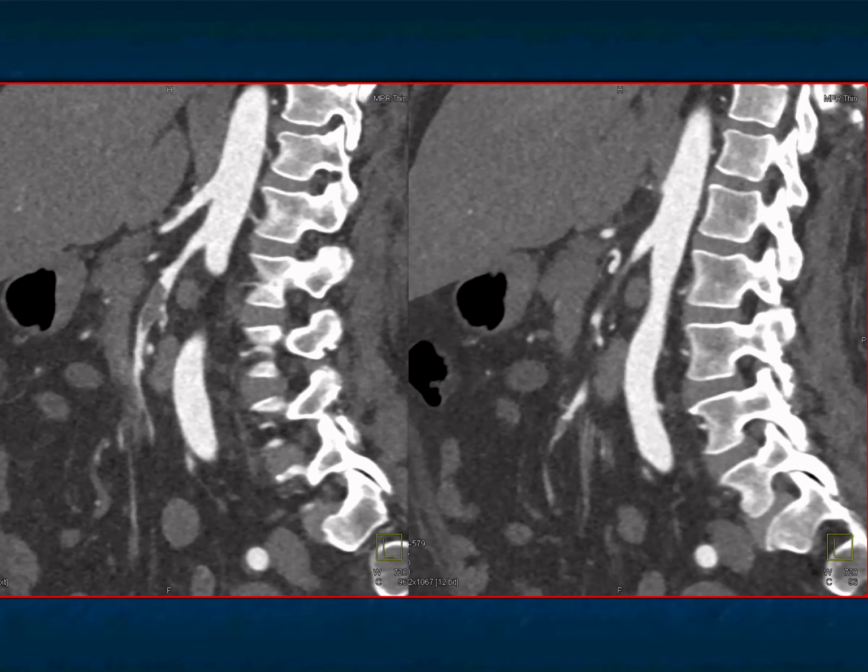Just to show you, I'm breaking the rule, but I didn't quiz you on it, look at the sagittal view showing you the clot in the SMA. My rule here, as I've always said, you always got to look at the sagittals for many reasons. If you don't look at the sagittal, things that involve proximally or more distally, the celiac or SMA, you're going to miss. This is a classic example of a case that was missed because it looked good proximally. There's no plaque. But in the middle of the vessel, you lost everything. Sagittal view makes it easy.